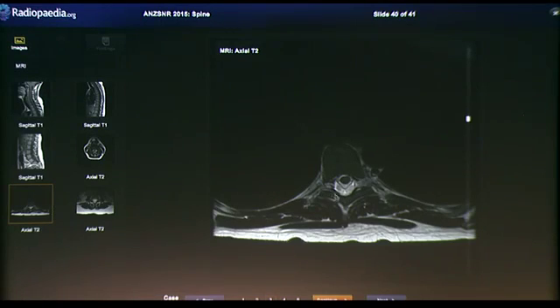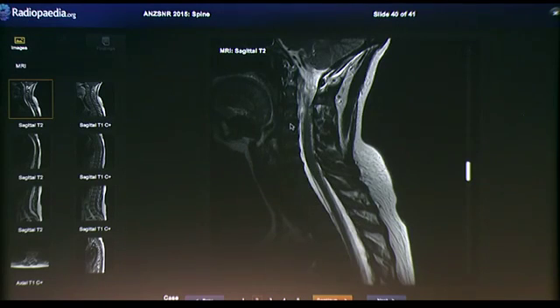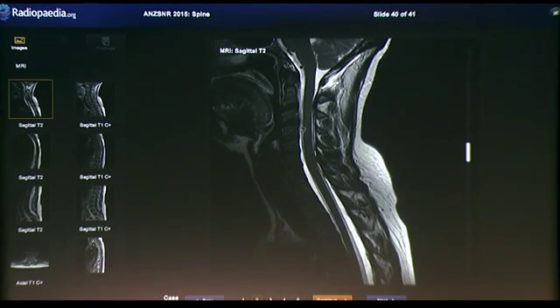So this is an unusual case for a few reasons. Postural headache gets investigated with the MRI brain for evidence of intracranial hypotension. It's pretty unusual to image the spine in these patients. And it's a bit of a pitfall. Sometimes when you do something that perhaps isn't done commonly, you don't know what the common imaging appearances are.